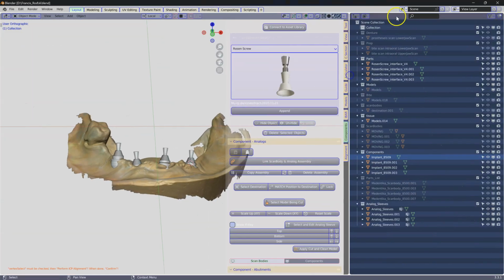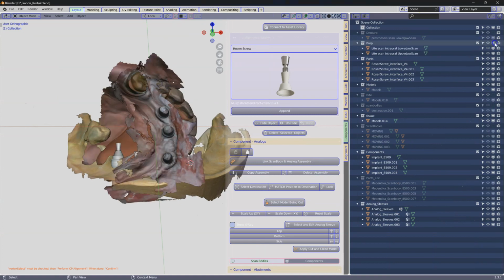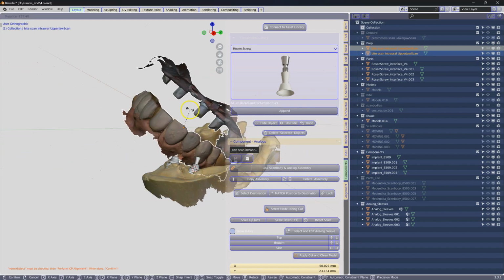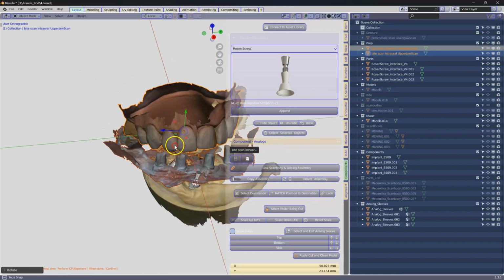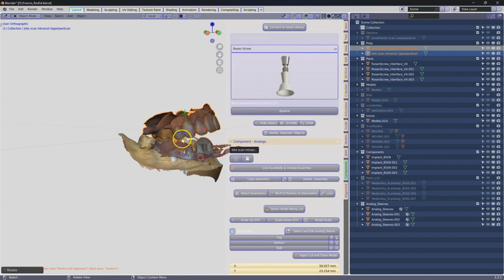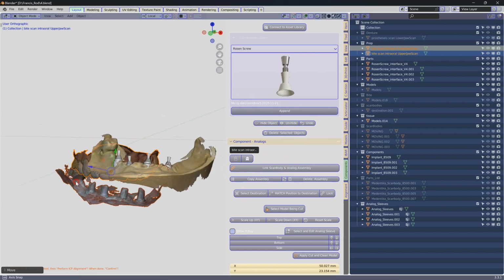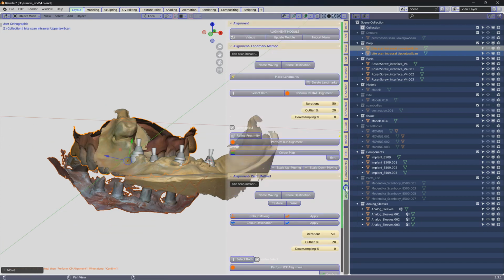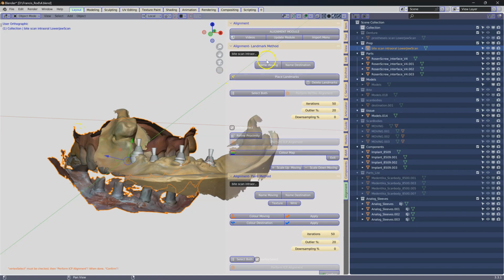Right, next I'm going to align a different model, which is the prep model. We're going to align these to the same position. So just rotate these a little bit so we can get a reference point of what we are doing. I'll just move this away a little bit like that. So here, pay attention to where we're plotting the points. Go to the alignment. This is our moving. First of all, join them up, Control J. Okay, so this is our moving, and this becomes our destination.